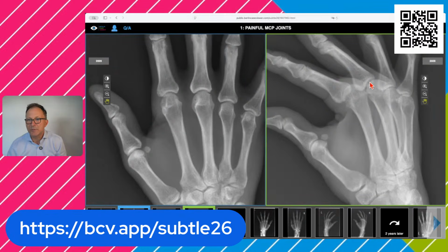So you see the normal joint space, about 2 millimeters. And here we have almost bone on bone in the oblique view. So we have a joint space narrowing. We can also appreciate it here, that that's the normal joint width, and that's a little bit smaller, but on the oblique view, you see clearly that there's some joint space narrowing.